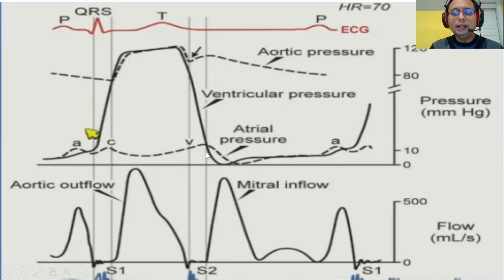Correspondingly, as the left ventricular pressure goes down slower, the mitral flow E wave will go down, and the atrial contraction will go higher. So your E will be low and A will be high, and your E over A will normally be less than 0.8. This is grade 1 diastolic dysfunction. I repeat: slower relaxation during the isovolumetric relaxation time, increase in IVRT, increase in deceleration time, yet normal left ventricular pressure and normal left atrial pressure.